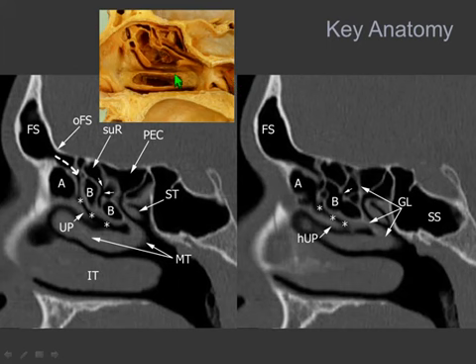It is important to note that the structures located off the midline are very important to understand the anatomy. Mostly the fact that the mucus coming from the frontal sinus and from the maxillary sinus, in this case beyond the inferior and the middle turbinate, and from the posterior cells of the ethmoid sinus and from the sphenoid sinus, will empty into two different paths.